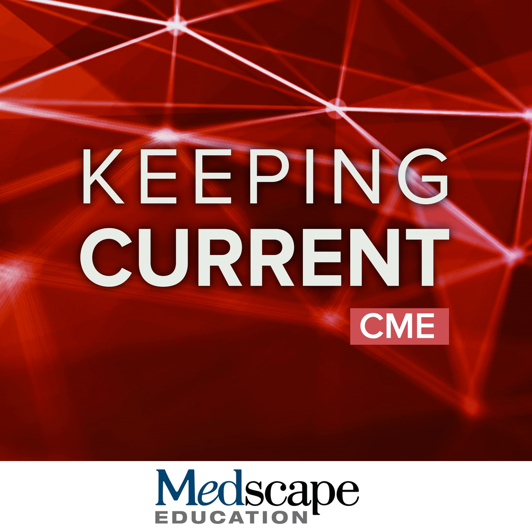is viable versus non-viable. You can also quantify the amount of scar in the myocardium as shown here. If you have scar that is over 45% in this study of the overall myocardium, it's a far worse prognosis compared to if you have scar occupying less than 15% of the overall myocardium.